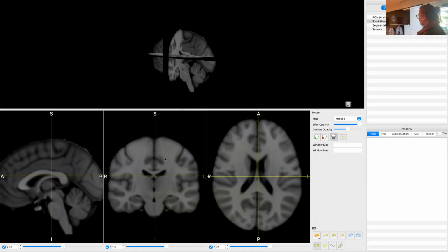Okay, now, first bad news. If you do tractography this way, it's obviously manual dissections. So you have to know your anatomy. So when I say we start with the corpus callosum, you should know where that is.